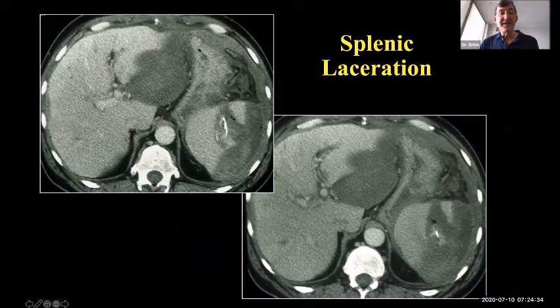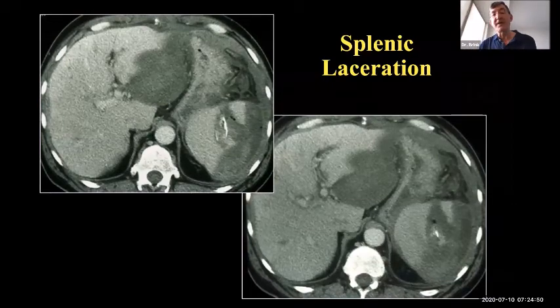You see the left gastric artery within it. And so this is in the greater peritoneal cavity, in the gastrohepatic recess of the greater peritoneal cavity, ventral to the caudate lobe, and thus not in the lesser sac, because it's pushing that lesser omentum posteriorly rather than anteriorly.